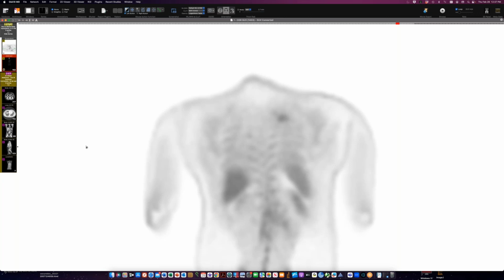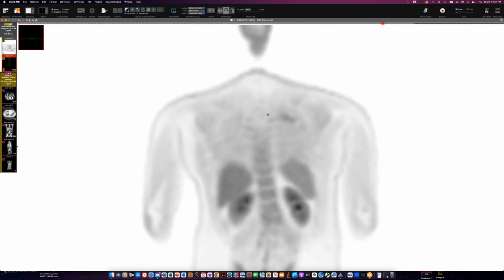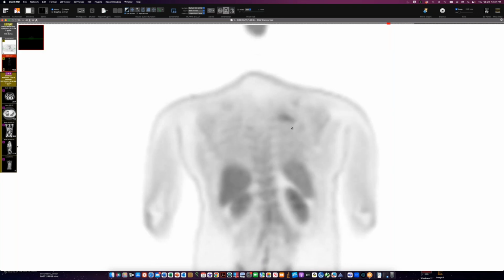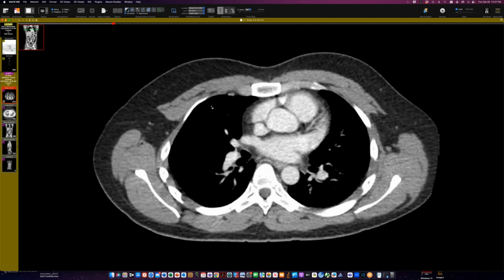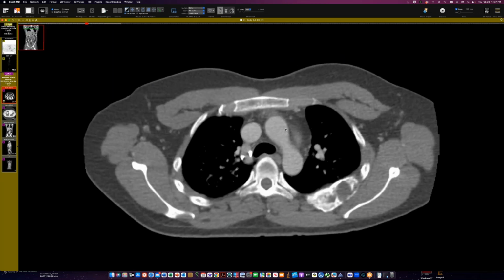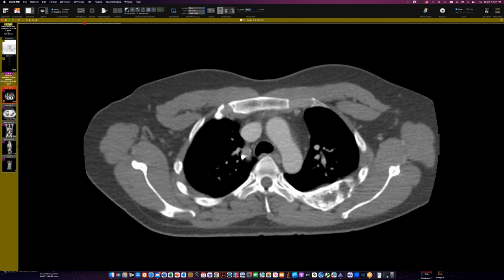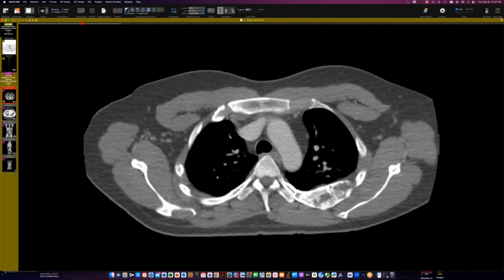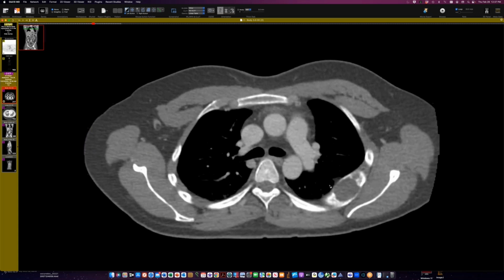And so this lesion was biopsied, and it turns out to be a fairly rare tumor for ribs, an aneurysmal bone cyst involving rib. And they said they thought there was a background of fibrous dysplasia. So I think the fibrous dysplasia component would go along with the fact that there is some ground glass kind of matrix to it, like this stuff here. So aneurysmal bone cyst in a setting maybe of fibrous dysplasia.